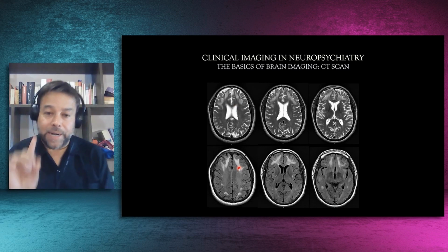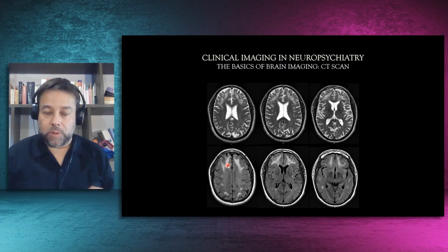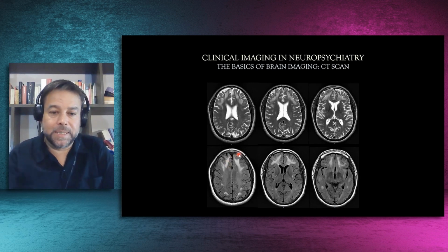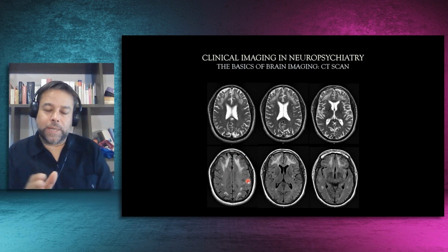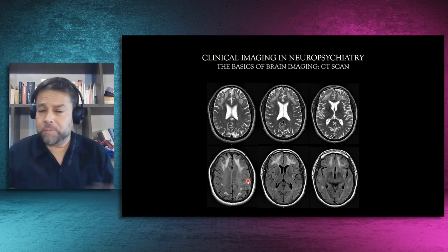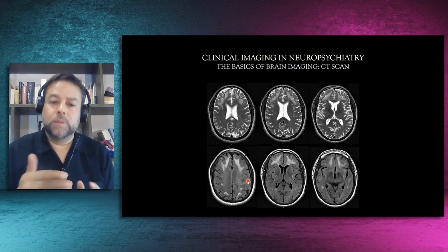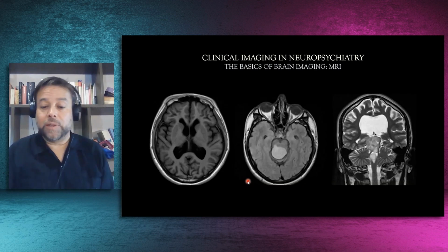And you can see in the FLAIR sequence the same lesion, but with more clarity because the contrast is better. And we can see that the same lesion is hyperintense. And now the brain cortex looks gray. So we have a better contrast. Some clinicians even start looking at the MRI through the FLAIR sequence to see if there's anything. And if they find something there, perhaps they would look at other sequences to see the correct behavior of the lesion.